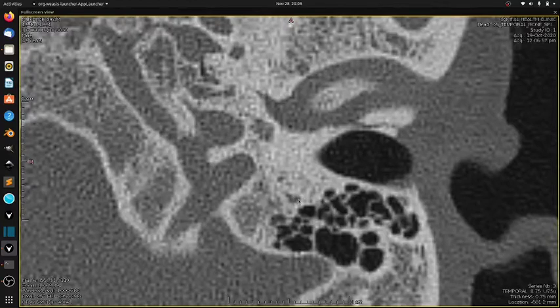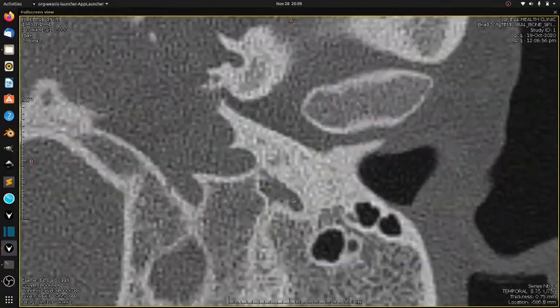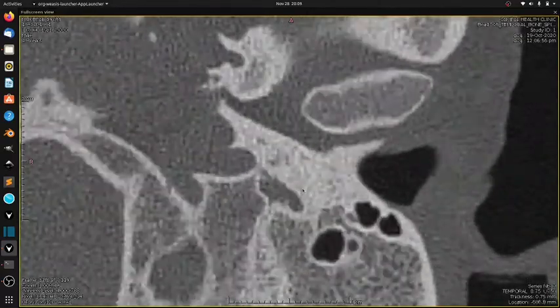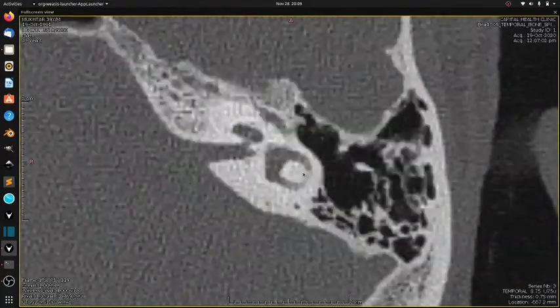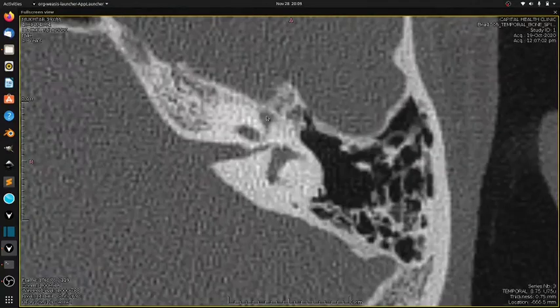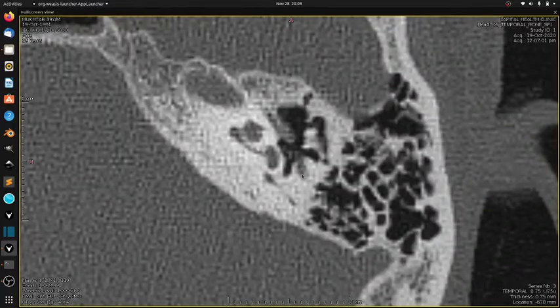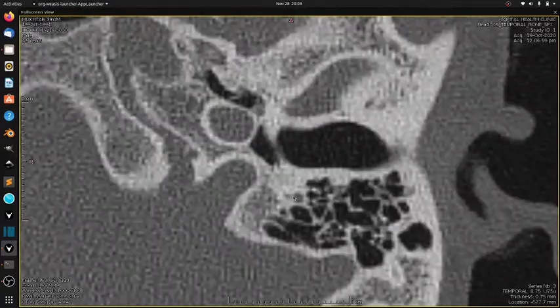This actually harbors the facial nerve, and this is the vertical segment of the facial nerve which exits through the stylomastoid foramen. So now you know the entire course of the facial nerve. Now I repeat once again: the small branch, the labyrinthine segment, then the first genu, then it goes back, then it forms the second genu where it forms the vertical segment.